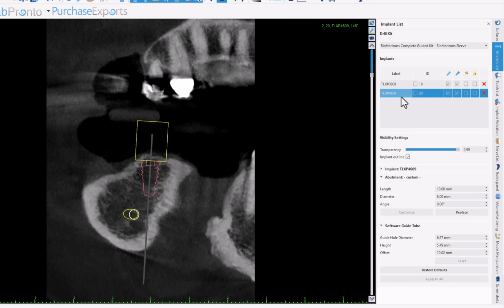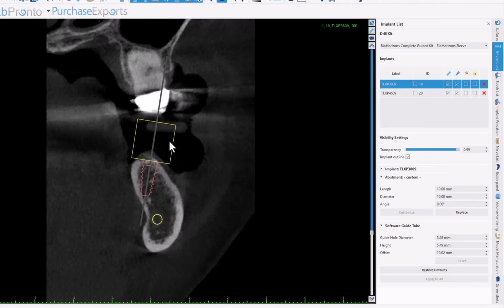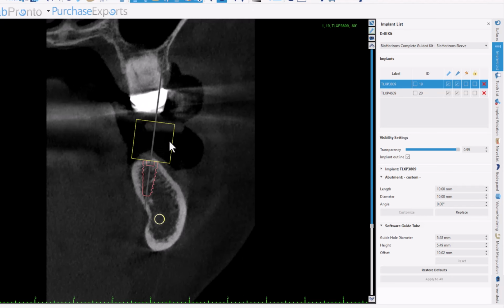It's a 4609. And then at the second molar site, notice the angles. It's not following the bone. It's following more where I think the teeth ought to be, but our wax up will help confirm that. Here again, this is just preliminary planning. I did it literally with the patient to show her how we plan implants and the fact that I thought that she had enough bone in order to do implants.